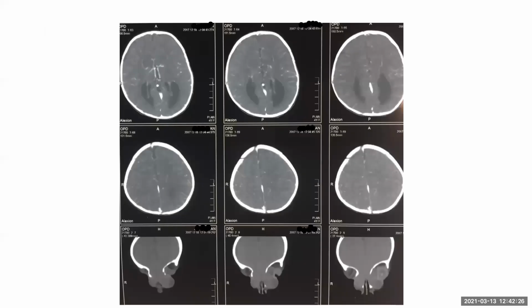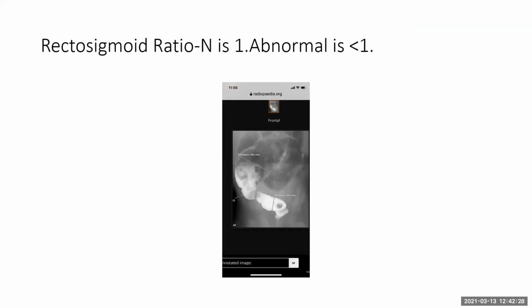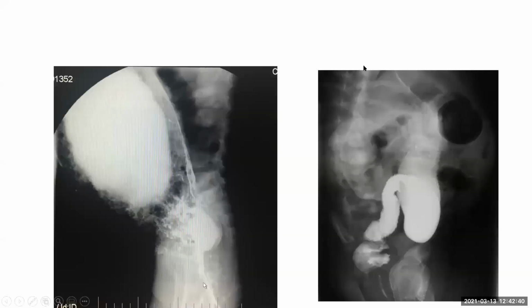hours film? Yes, a 24 hours film is required when we are not sure about the diagnosis. That is what our routine is, right? When we see this, and this is like typical Hirschsprung, and this lateral case, this is another case, in fact, the one of which I showed you the AP.